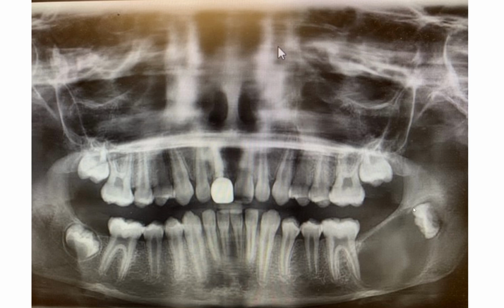The follicular space here is very tight, and you don't see radiolucency extending into the CEJ. So that's another subtle feature that you can see to perhaps disfavor the diagnosis of dentigerous cyst. But again, if this is the only thing I had, I think I would have still considered dentigerous cyst on my differential diagnosis. So this was biopsied, and the biopsy result was OKC.